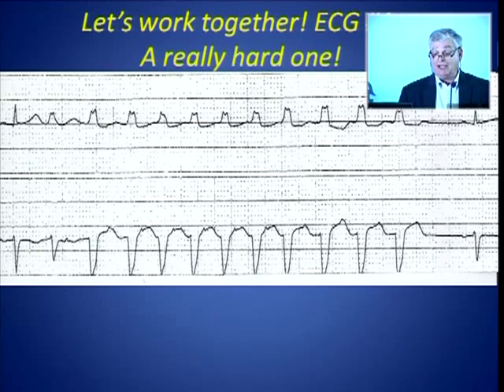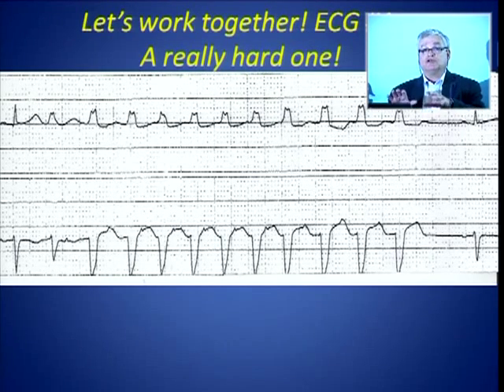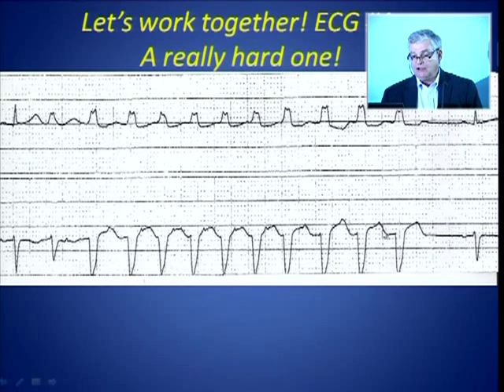Just that there is a relationship, one-to-one. You see how using terminology that doesn't focus you in on a diagnosis opens up the possibilities. Okay, one-to-one until the VA interval starts prolonging, and finally it terminates with a V and no A.